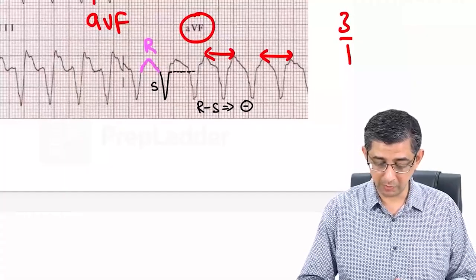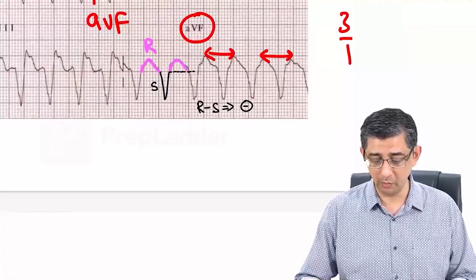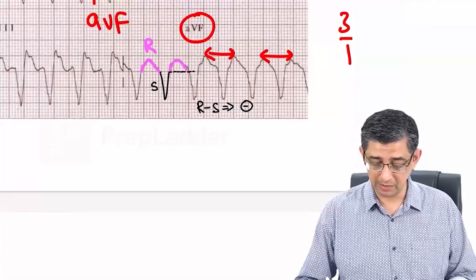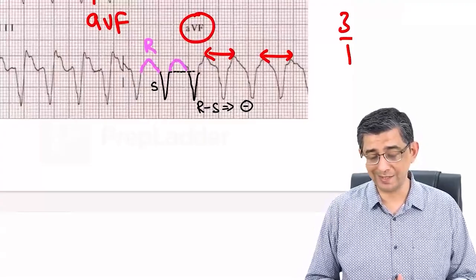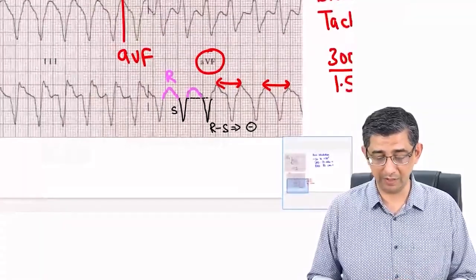The R wave, which is a positive wave, is slurred because of intermyocyte conduction, which you will be more comfortable with in the subsequent part of the discussion when I talk about VT. But at this junction, you can very well notice that as compared to the baseline, the depth of the S is much more than that of R. That is why I have put a negative vector here.